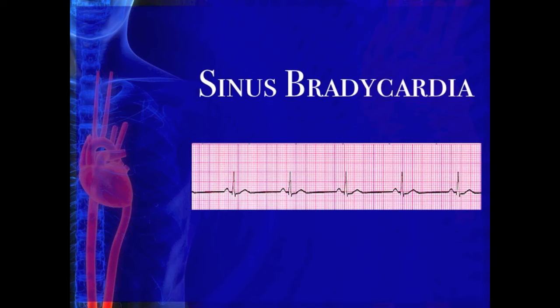This rhythm is sinus bradycardia. The ECG of sinus bradycardia presents the same as a normal sinus rhythm with one difference. The heart rate is estimated to be less than 60 beats per minute.